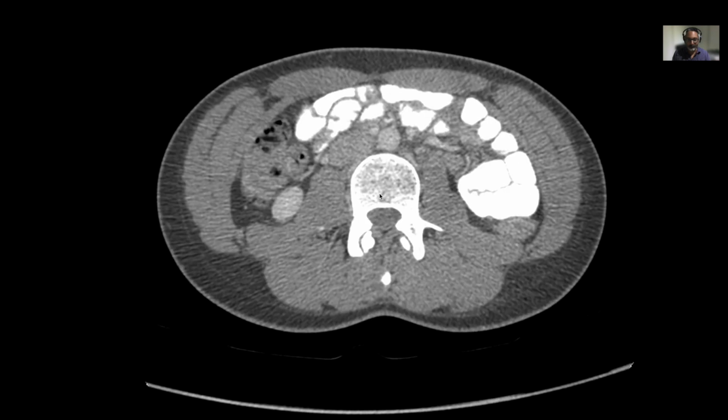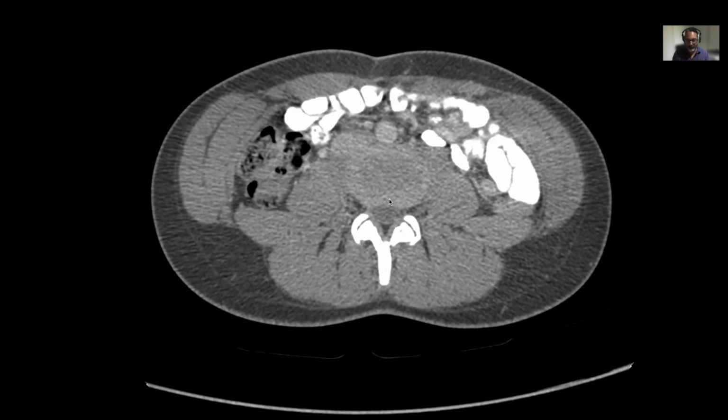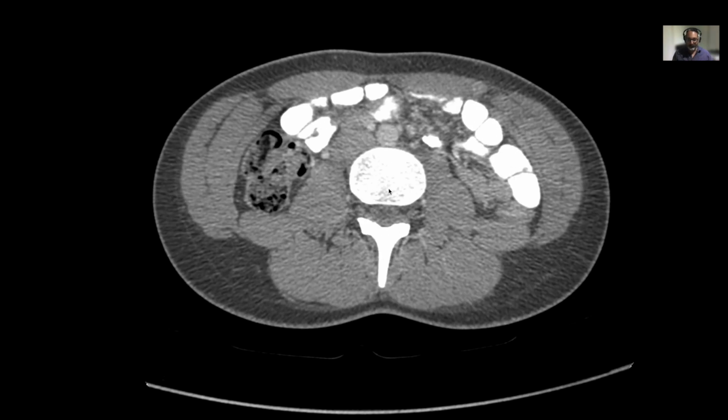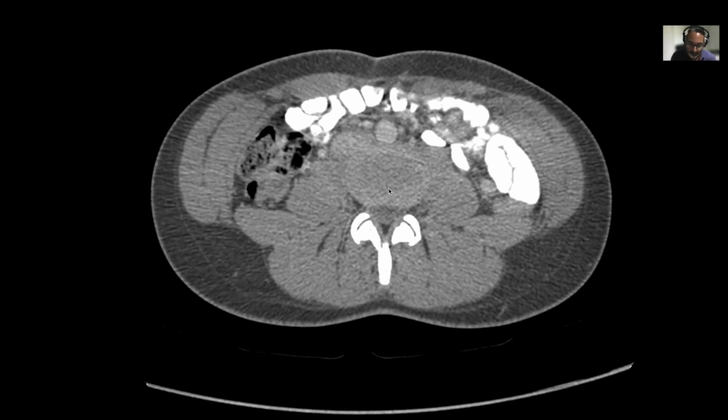And as you pass through different vertebra, you will pass through the intervertebral disc. It's not too clear, but the outside of the intervertebral disc, called the annulus fibrosus, is a fibrous tissue, and inside is the nucleus pulposus, which is a bit more jelly-like and a bit more flexible. You can look at intervertebral discs in this section, but they are better seen in the sagittal section that I will show you in a little bit.